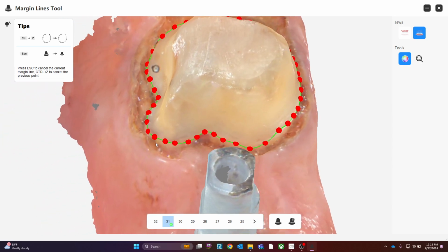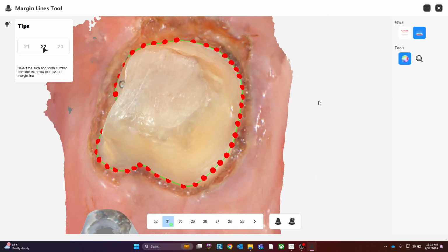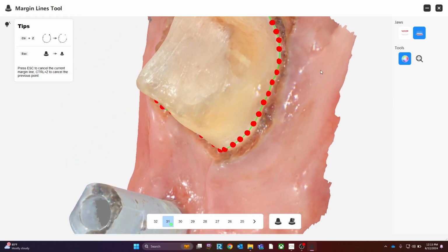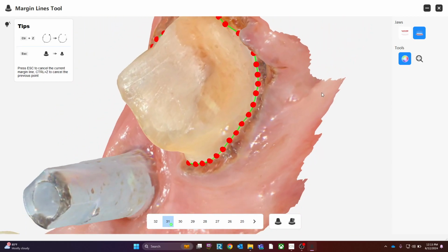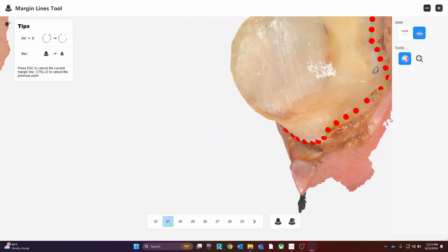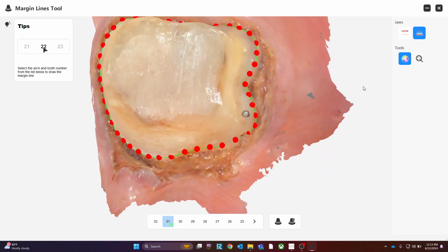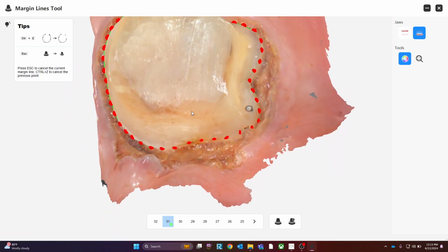There you go. This one, I'll bring a little up, this one a little bit down. Okay. So make sure you double check every single angle, since it is in your capacity to do so anyway.